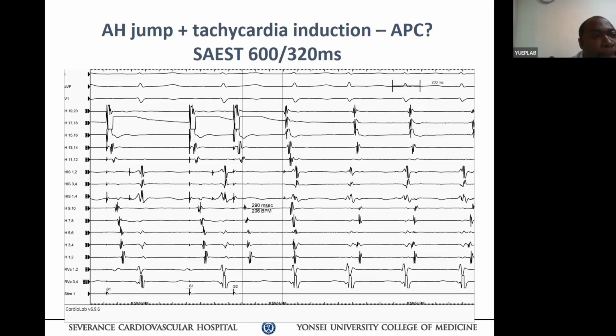So you may want to read about that paper. It's an important difference of diagnosis. This is a rare diagnosis, but such a disease exists. So indeed, this is your argument, this is AVNRT. Somebody is going to argue with you: how come your higher atrium is earlier than CS if it's AV node reentry?